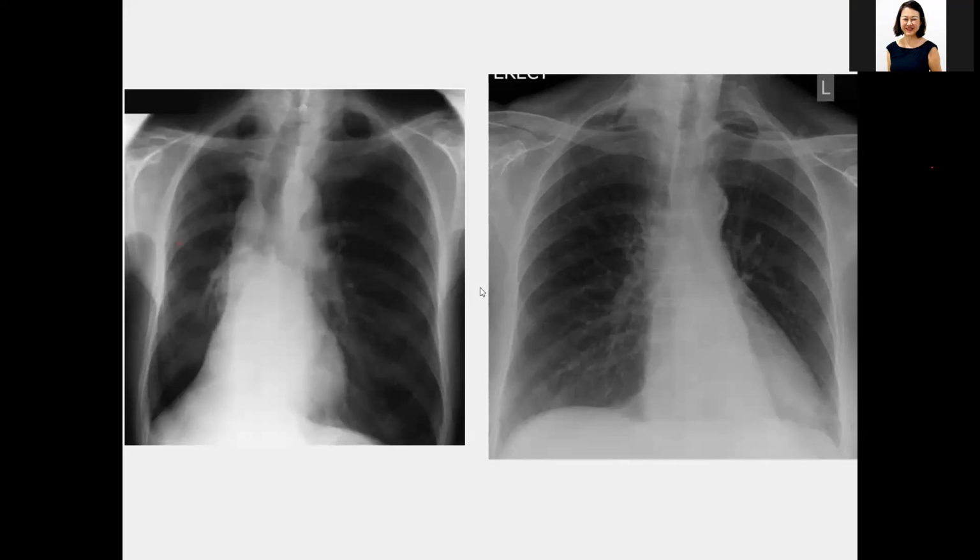Okay, right middle lobe collapse with right tracheal deviation. I think the right tracheal deviation cannot be missed. Yeah, that one is really... I think the whole mediastinum is shifted to the right, actually. Yes, actually, there's some rotation also. These are the X-rays, see. So somebody said a triangular heart shape.